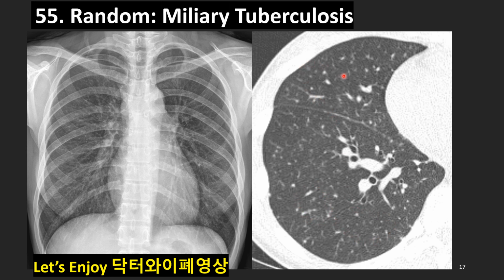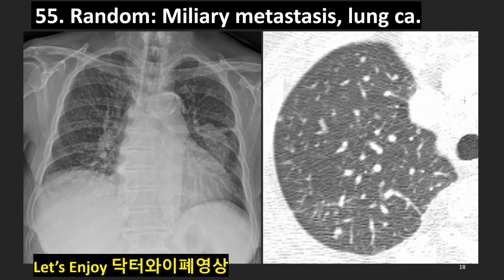So we sometimes call it miliary tuberculosis rather than hematogenous tuberculosis. This is miliary tuberculosis of young women. There are many scattered micronodules in right and left lung with lymph node enlargement in young women. This is miliary tuberculosis. Maybe this will be the last picture of this museum.